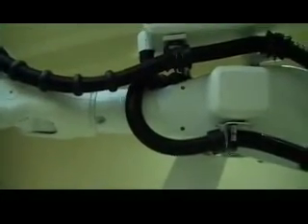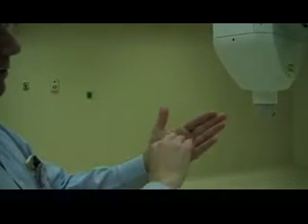And so basically, the idea is that by moving the linear accelerator around, every beam goes through the patient in a unique direction. And that means radiation is doing tissue damage as it goes through the patient. So it's going to do damage all the way through, but with one beam, it's not going to be very much damage. But when you start adding beams together, wherever the beams intersect, you'll get more and more damage. And so by having many beams, like 100 beams, intersecting, the intersection of those 100 beams gets a lot of damage, whereas each individual pathway gets little damage.